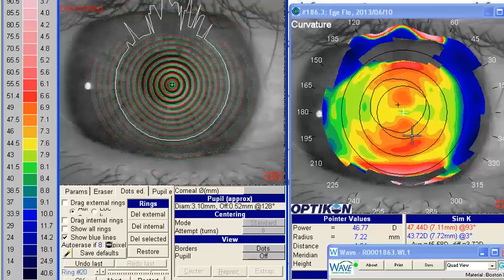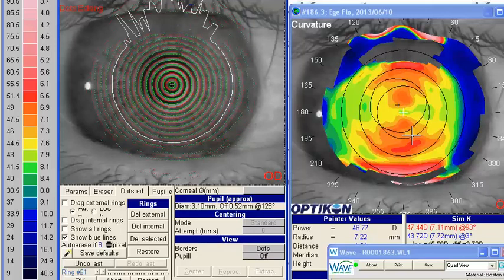And this sometimes takes a little while to get this thing reasonable. You don't have to be perfect, but I just knock out some of the real erroneous stuff. And this is going to get a little more tricky here, I think. Let's see if we can simulate that. It's not too bad. And we'll see if we can go one more.